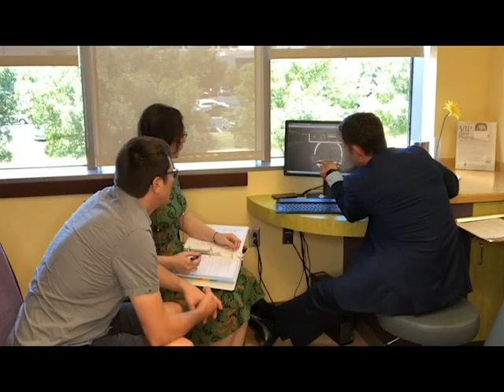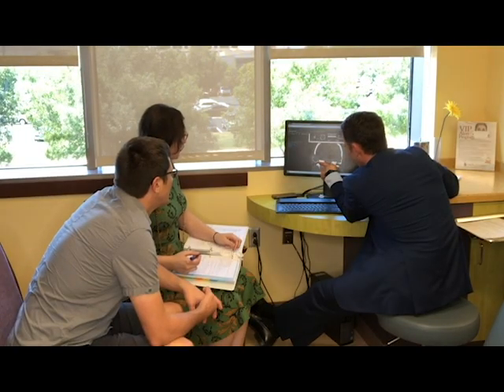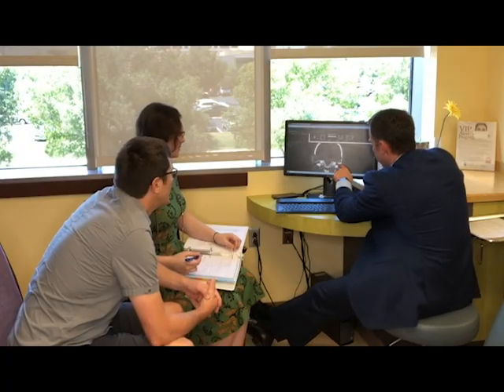So, here are those ear bones. I don't think the bones themselves are affected, but the roof of this inner, what we call the middle ear, I'm not sure it's unaffected. So again, here's the normal roof.